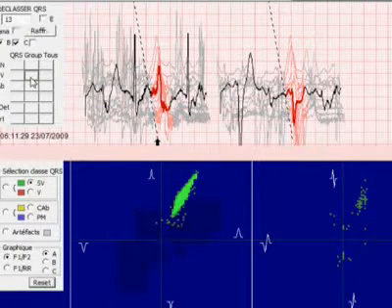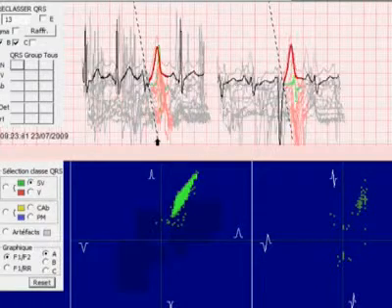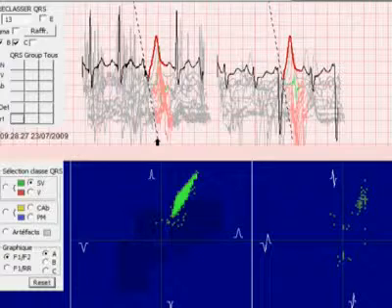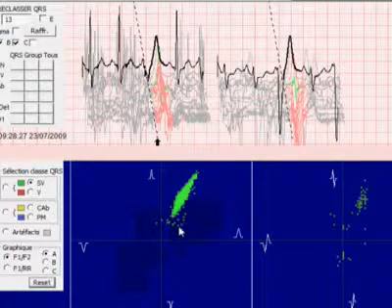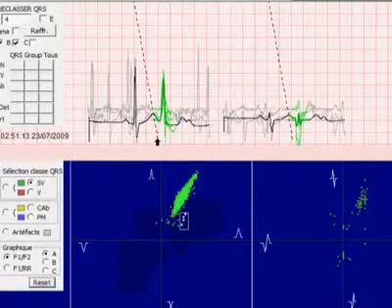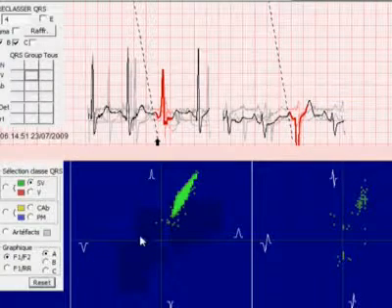They are all reclassified as V, and one QRS is corrected as supraventricular, and two other QRS are corrected as artifacts. Same problem with the higher areas close to the cloud. Few QRS are classified either as ventricular or as artifact.